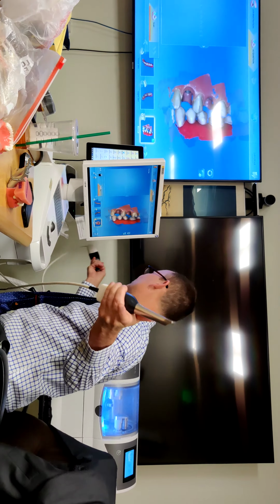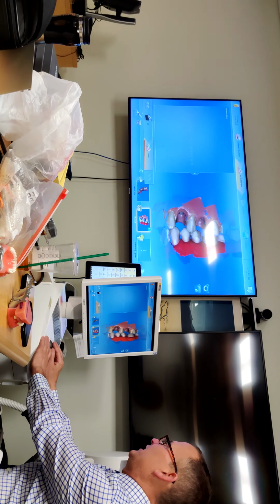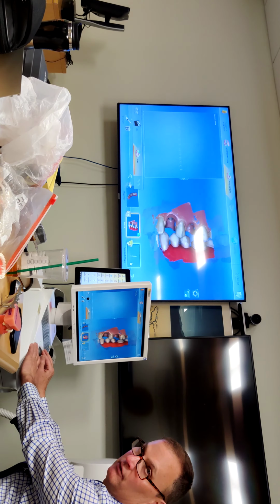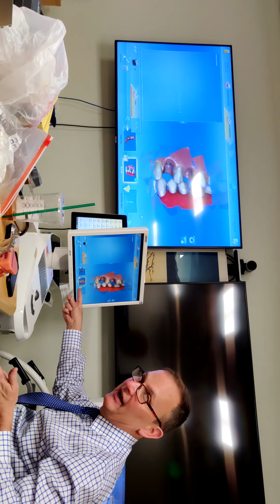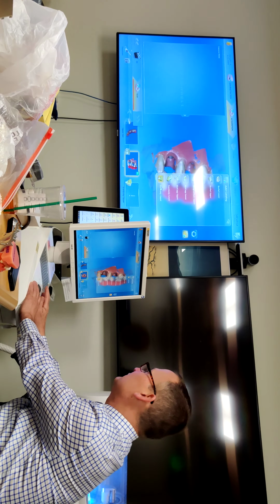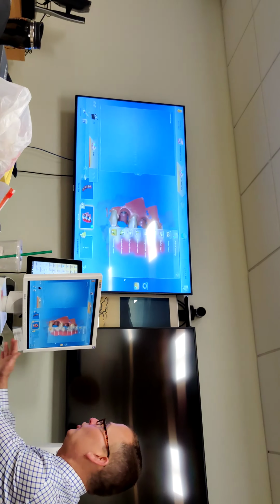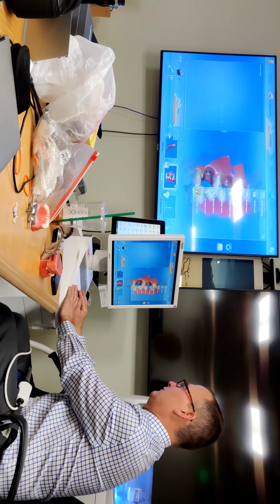Now, we don't have our scan body, but it's here. Do you see it? Right there, see the arrow? It won't let me go forward because I don't have my scan body impression. If I called it a crown, it's not going to ask for that. So I come here and add to the catalog, and I would add the upper scan body, and it would put it down here. If I called it a crown, I can always add the scan body.